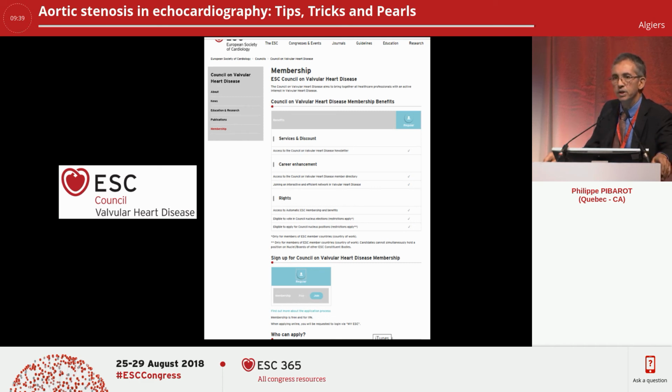So it's tricky indeed. And what I do generally when you get the stroke volume by Doppler in the LVOT, I try to see if it makes sense with the ventricle that I have, the dimension, and the LV ejection fraction. If I have a low stroke volume with a normal size ventricle and a preserved LV ejection fraction and no MR, there is something wrong, right? And then we go back to the velocity or diameter. This is a crucial point.